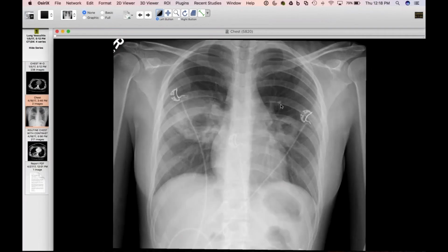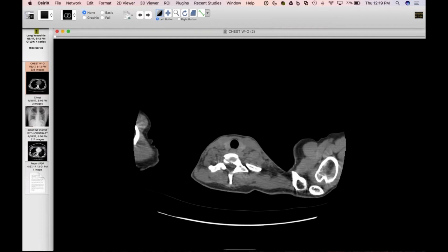This radiograph came in last week, and it reminds me of the case that David showed of the symmetric apical aspergillomas that the patient had. That's not what this is. This is a 20-year-old woman who presented in January with panhypopituitarism and was found to have granulomatous hypophysitis. They did a biopsy and didn't grow anything, but it was necrotizing granulomatous inflammation, and that was around this time.